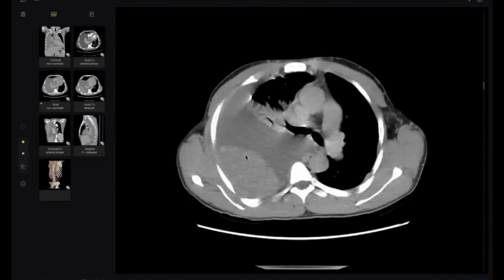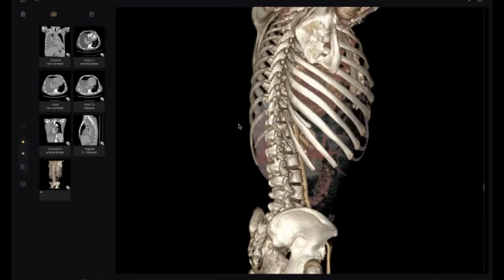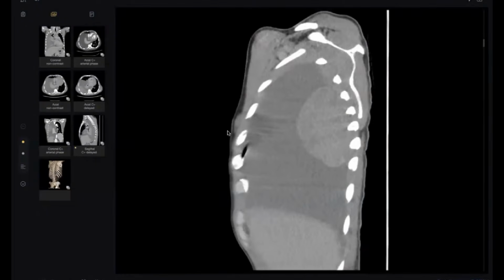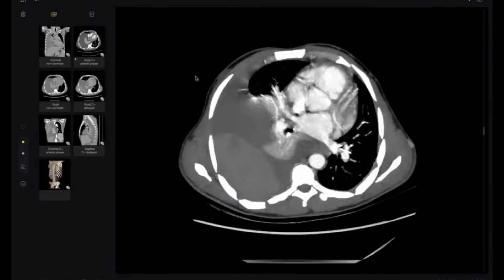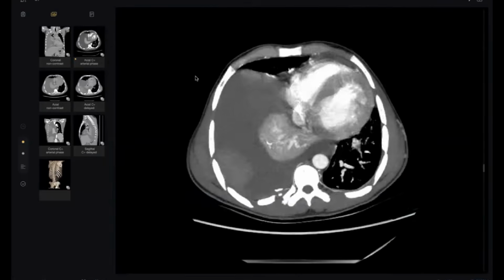Okay, whatever the cause, the next step will be sure a CT angio or any type of angio, conventional, but at least you lighted the pathway in front of the clinician. This is a hemorrhage and this is a large hematoma. So we must concentrate on the vessels.